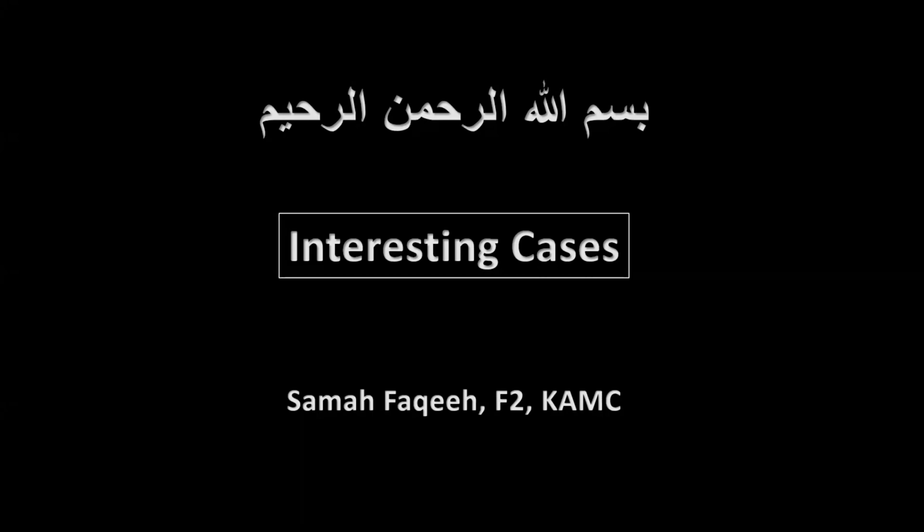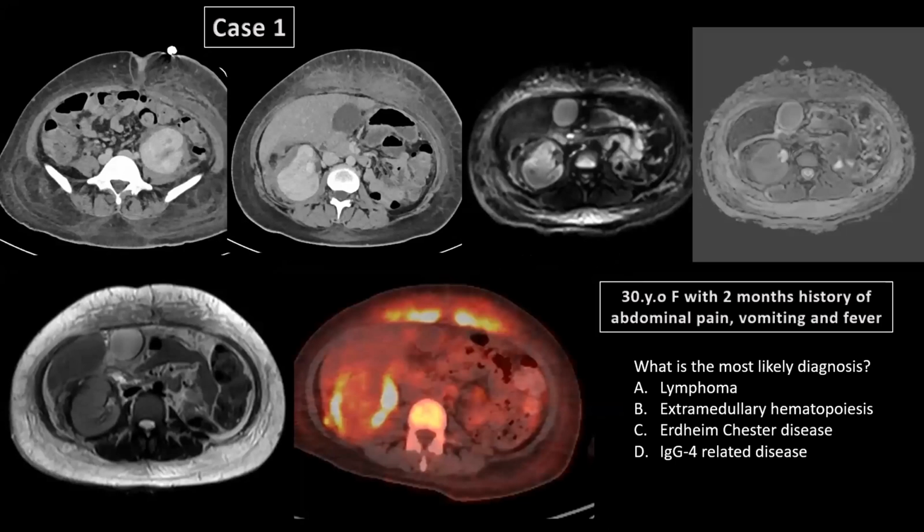So let's begin. This is our first case. This is a 30-year-old female with 2 months history of abdominal pain, vomiting, and fever. I'm providing the CT cuts, the diffusion weighted images, T2 weighted image, and a PET-CT axial image. So what is your most likely diagnosis? I will launch the poll now.